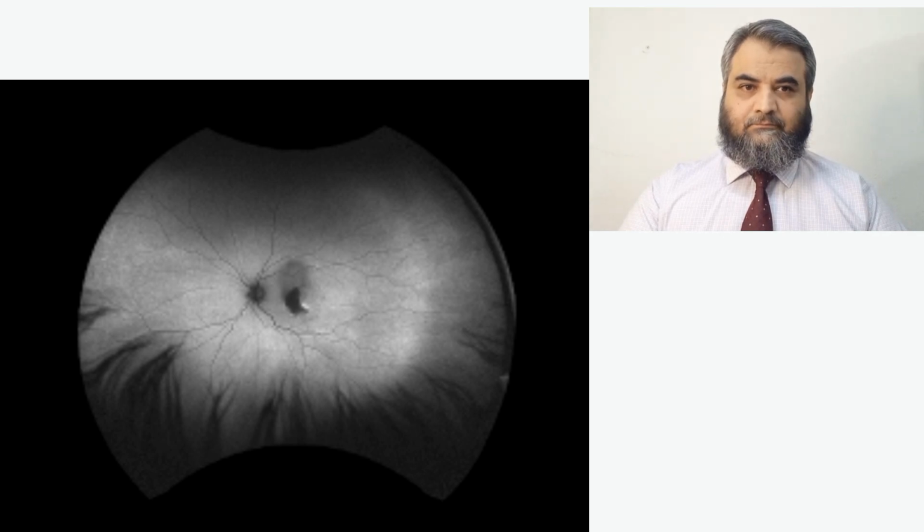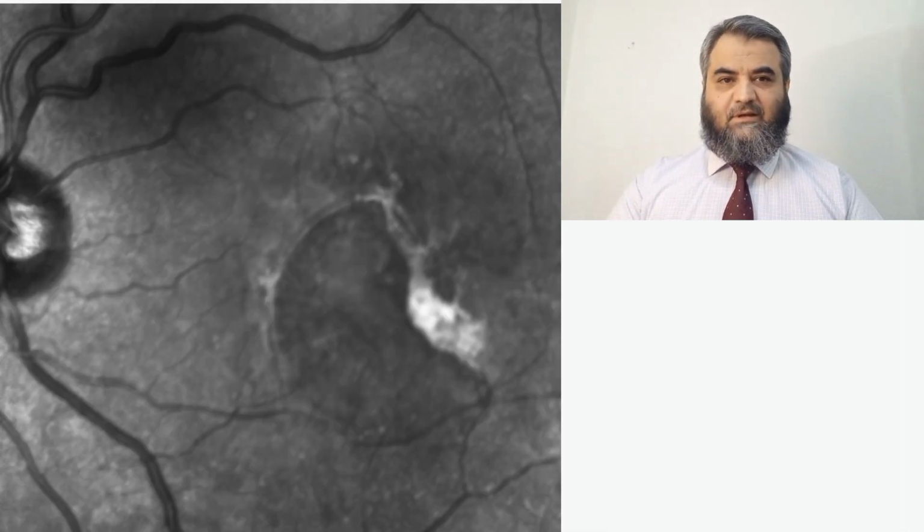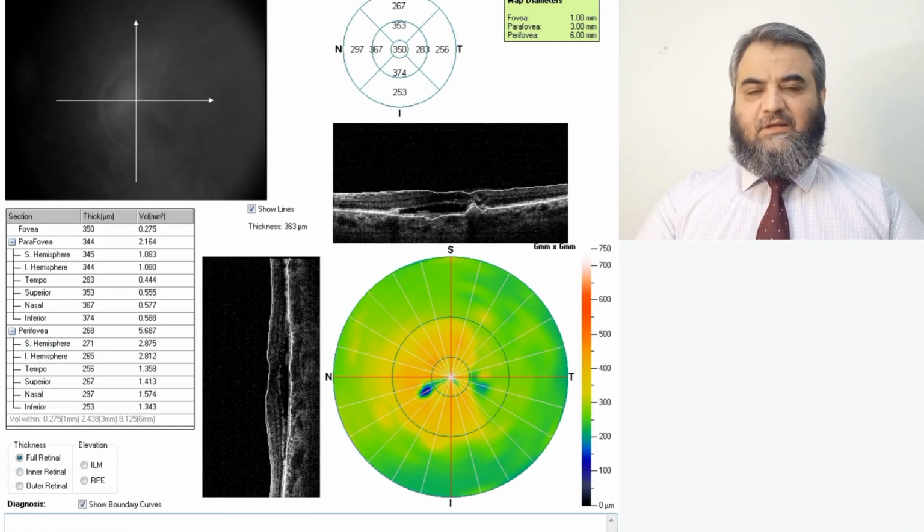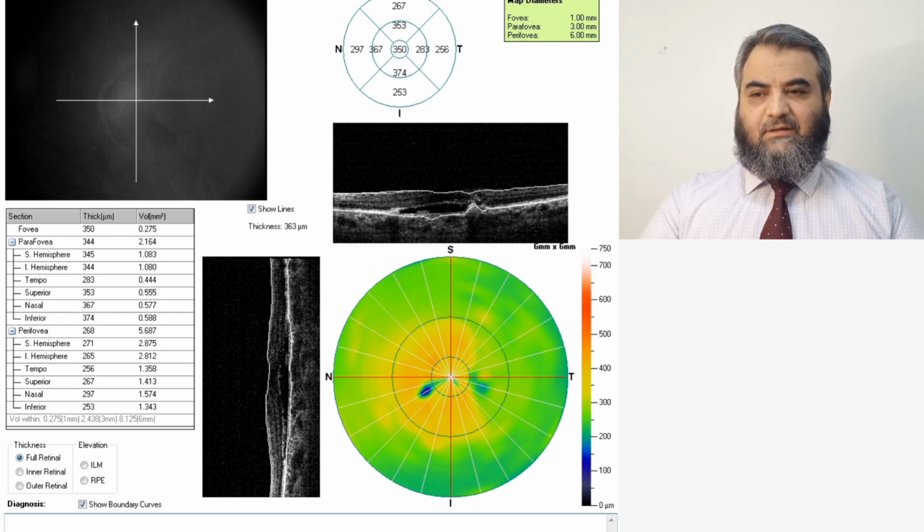autofluorescence. This is another OCT en face. Here again you can see well-demarcated margins of that RPE tear and rolled margins to some extent, and a centrally located lesion. So this is another OCT slide. As I mentioned, he received multiple intravitreal Eylea injections, and now you can see that the elevation of this pigment epithelial detachment has decreased substantially.